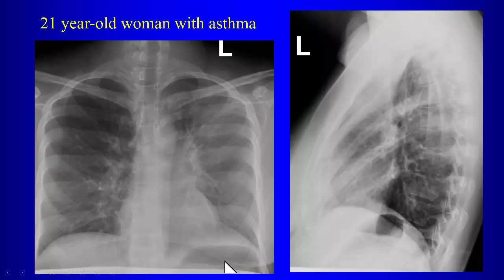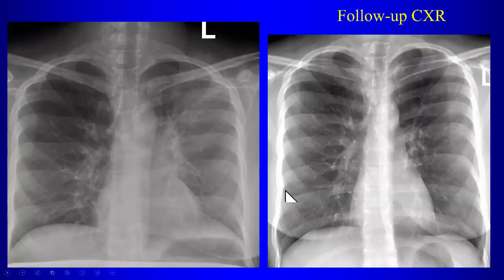Peaked. Yeah. So there's atelectasis. Of what? Okay. So what do you think this is then? That's the collapsed left upper lobe. All right. So in a patient with asthma who develops atelectasis, we think the cause is going to be what? Mucus. Mucus plugging, right. They develop mucus plugging. So follow-up chest x-ray. So this is what the patient should look like. Okay. So again, look at the difference in the left diaphragm, this whole hazy opacity here.